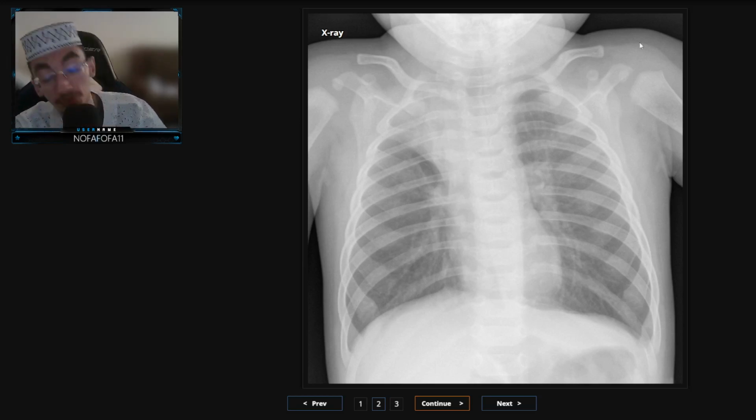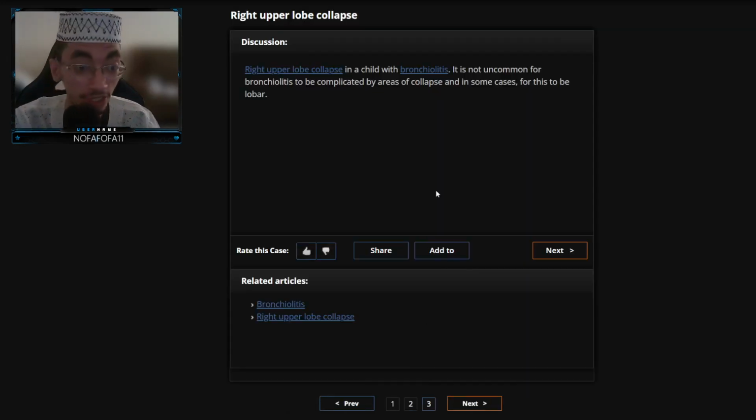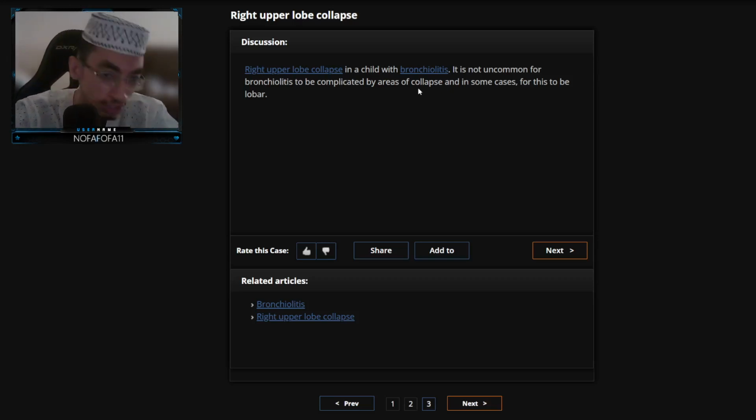Now, to finish off the video and tell you the case presentation, obviously, as you can see here, right upper lobe atelectasis. Here it's telling you in the case presentation, the cause of right upper lobe collapse for this baby was due to bronchiolitis. Now, before we end the video, let me teach you the concept. Let me tell you the difference between an atelectasis and pneumothorax, because both of them mean lung collapse.